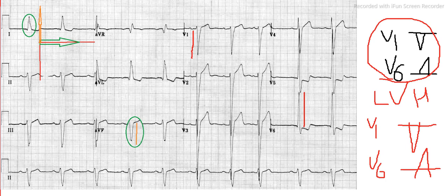When you draw an imaginary perpendicular line, I draw from here to here an imaginary perpendicular line, and from here to here, and then I take the resultant vector. So this will be the resultant vector here. You see this resultant vector is making greater than minus 30-degree angle. This resultant vector is in this direction, and it is of course indicating that it is left axis deviated. So it supports our finding that it is left ventricular hypertrophy.